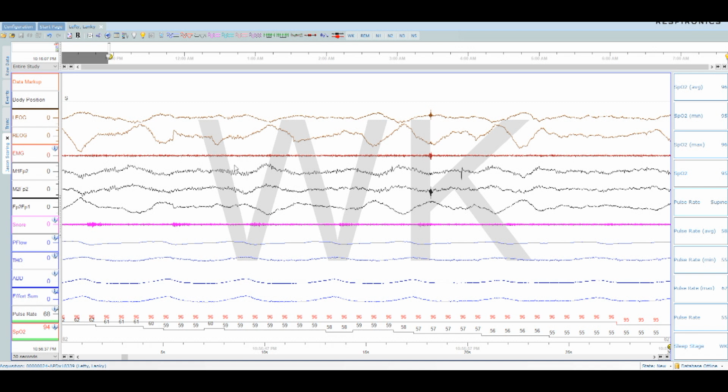All right, so we have alpha waves, 8 to 12 cycles per second. Right here, it looks like we have a transition. Doesn't this look different, boys and girls, than this over here? By the way, this M1 FP2, M2 FP2, these are both EEG channels. Now, it's not like a full-on sleep study. This is a little different. It's a little modified. It's a home sleep test that I use, and I have a little extra yoke that I can get EEG out of.